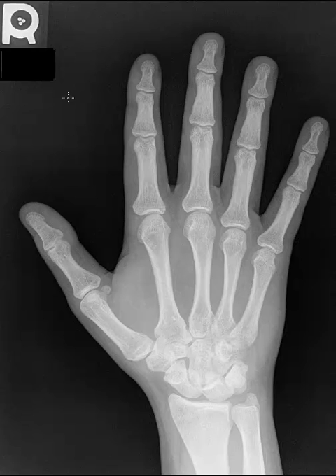Next, the joint made between the radius and ulna that you see in the wrist is the distal radioulnar joint. It's important to say distal because there is a proximal radioulnar joint. Here is the radiocarpal articulation between the distal radius and the carpal bones. They call this shared radiocarpal joint space.